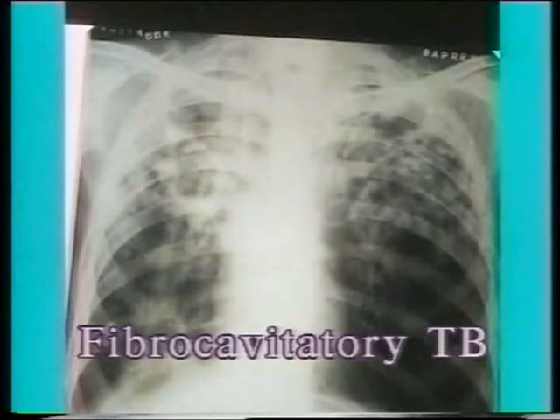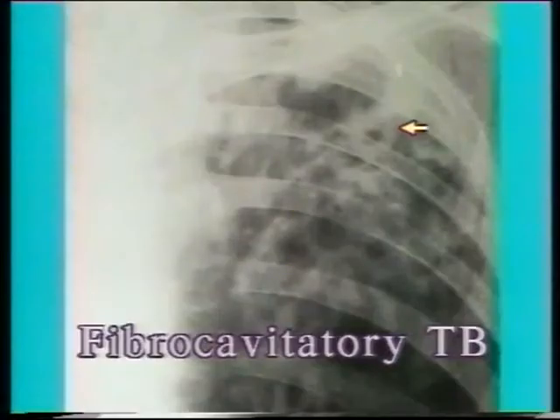In this X-ray, we see advanced fibrocavitatory lesions on both the sides. Note the very dense and sharply defined shadows of fibrosis on both sides, and on the left side, amidst the fibrosis, the arrow points to one of the small thick-walled cavities.